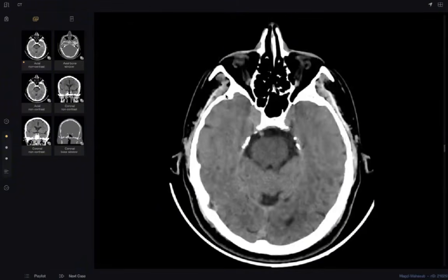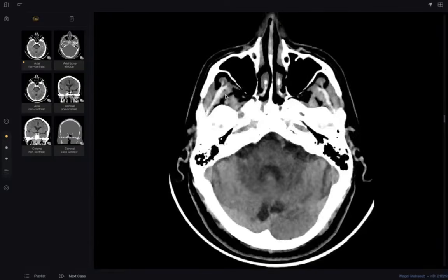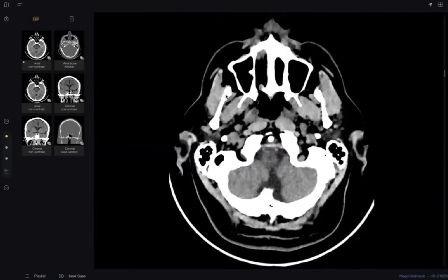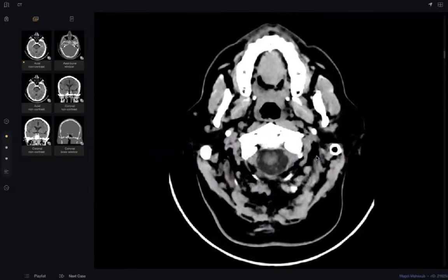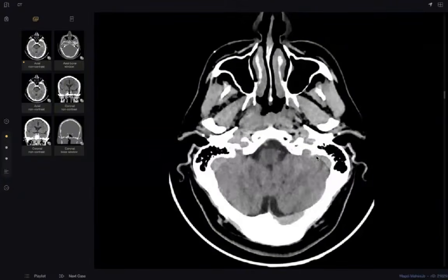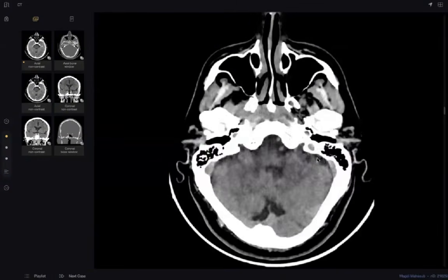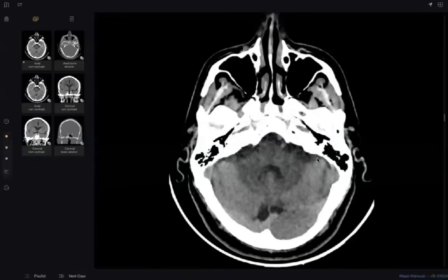Before watching the bone window, have another look. There is no crowding at foramen magnum. The prevertebral muscles are normal, and I cannot see any hyperdensity within the visualized venous sinuses. Middle ear cavities appear normal.